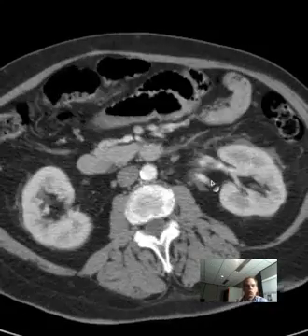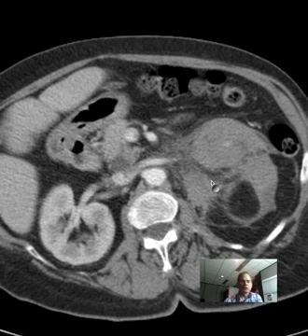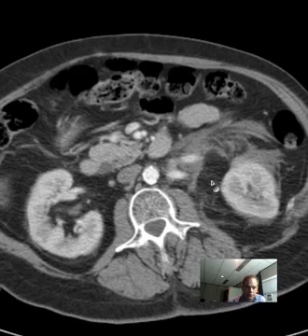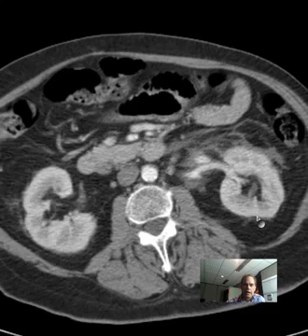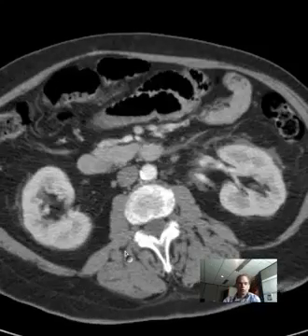Okay, so what is abnormal? There is an abnormality. What's abnormal? You kind of find yourself sometimes lost with where to begin. So the space that is involved is the retroperitoneum, and I think you can see that very clearly here. You see the kidney is a retroperitoneal structure. It is in the perirenal space, and you remember that there's an anterior pararenal space and a posterior pararenal space. So what has happened here?